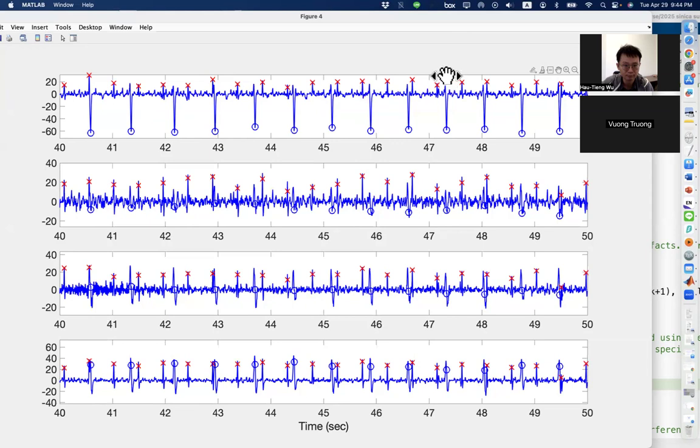Okay, so our mission right now is, can we decompose the maternal ECG and the fetal ECG? Or if we can recover the maternal ECG and the fetal ECG, that is the ultimate goal. Or would it be possible to just estimate fetal heart rate or fetal R peaks? Either way, ultimately, we want to do a decomposition so that we can get full information about the maternal ECG and the fetal ECG.